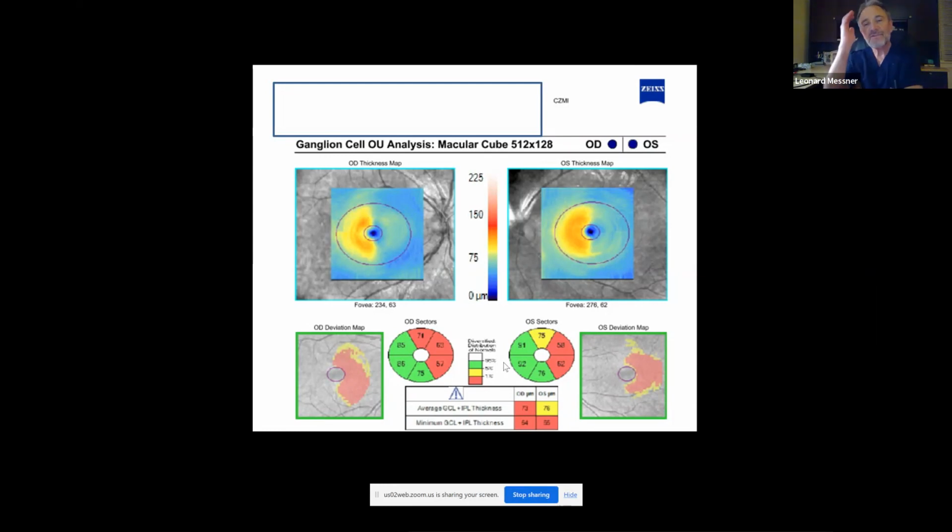And again, this is classic for individuals that have both optic tract lesions as well as optic radiation lesions. So if you're working somebody up for glaucoma and you see this, they may have glaucoma, but they've got something else going on within the brain. They've got a retrochiasmal lesion opposite the side of the hemifield thinning to the retina. In this case, a left hemispherectomy that resulted in the right homonymous hemianopia and this right hemifield thinning of the ganglion cell complex.